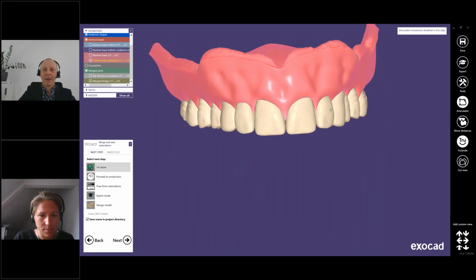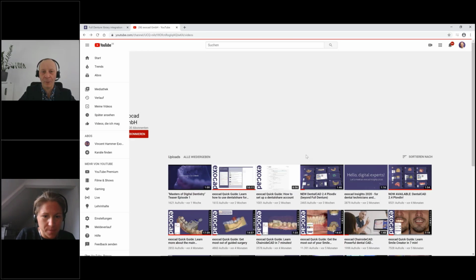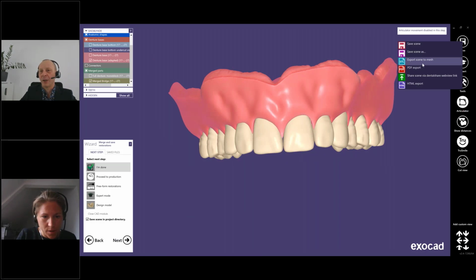Please don't forget that we have a DentalShare service, and on our YouTube channel we have fresh new DentalShare quick guides on how to set up a DentalShare account and how to use DentalShare. Please feel free to check these videos. It's very useful, and as an option you can export this scene as HTML to show your dentist, without any software, how the design looks, to confirm.